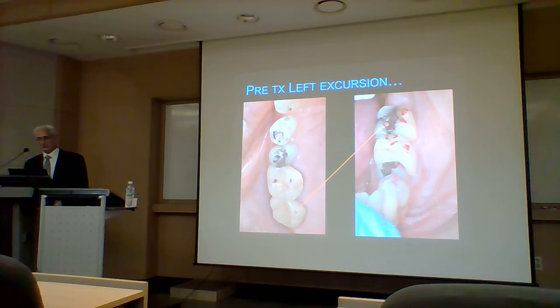So we would treat lingual to lingual contacts. And I'm just going to show you where they line up to each other. Lingual to lingual again, lingual to lingual again. Right? These lingual to lingual contacts are powerful activators of high muscle firing, which we cannot see from the buccal at all. 그러니까 링걸 쪽에서 컨택되는 것들이 이제 머슬 액티비티를 높이는데 굉장히 중요하게 작용하는 것들인데 이걸 버컬 쪽에서 봐가지고 전혀 알 수가 없는 컨택 포인트죠.